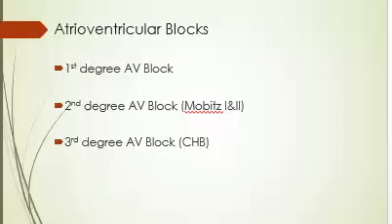Now, this is where things get weird. And don't get mad at me, but I had to throw them in here because everybody needs to know about a block. And as an instructor teaching in critical care courses, I always want to put on a first degree AV block or a complete third degree AV block. It is my thing. I'm going to do it. So we're going to talk about atrioventricular blocks. Okay, the first degree AV block, the second degree AV block, and to confuse nursing, we put two of them in there. So there's two types. And then there is the third degree AV block, which is also called the complete heart block.